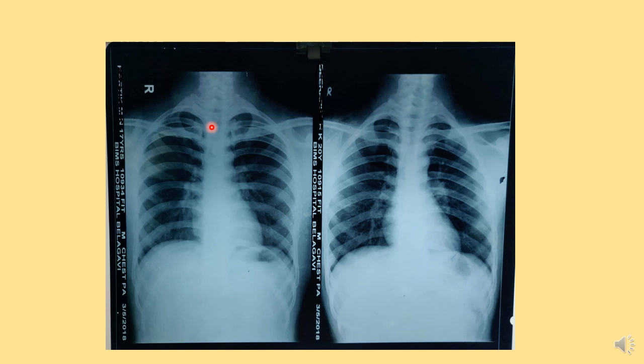In this way, where the person is sitting and rays are passing from back to front, he will usually keep both his palms on his head so that the scapula takes its position away from the lung fields. So we are not observing the scapula clearly here. This is the medial border of the scapula. You can see this is the coracoid process. So this is the medial border of the scapula, which has been taken away from the field to have a clear vision of the lung fields. This position is maintained by the patient so that the scapula is taken away from the field.